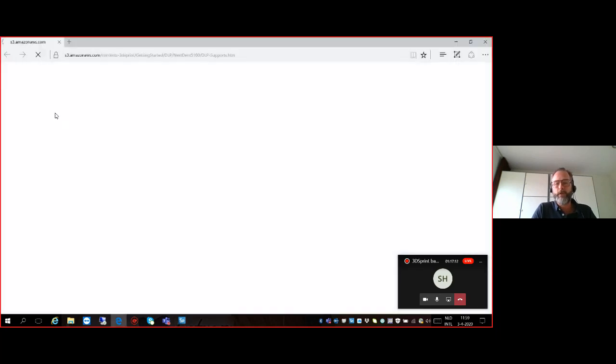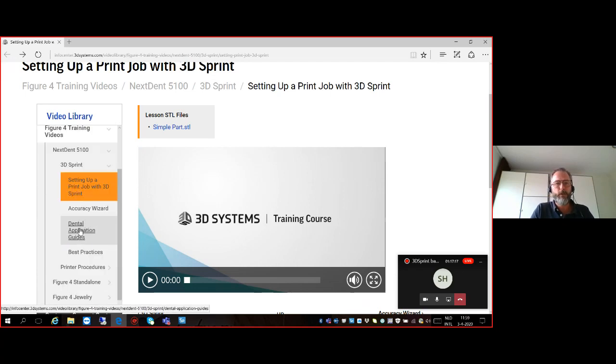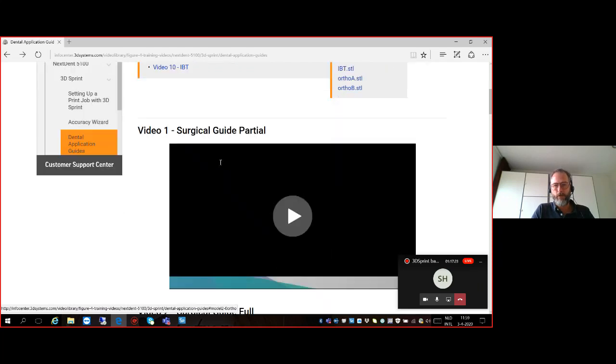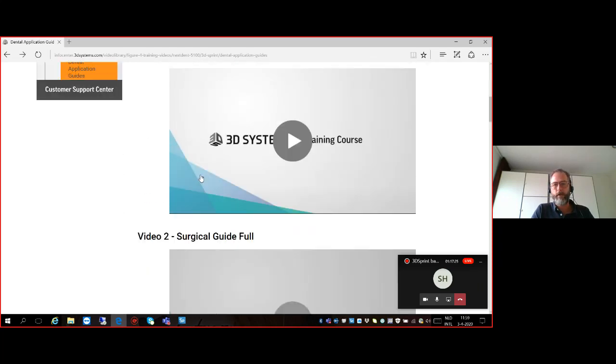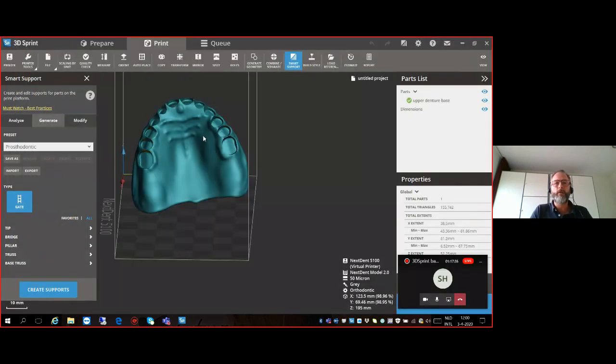And this is very nice, especially if you're new with an application. You can find all the different dental application guides here, and we have instruction videos on each and every application. So everything I showed you is more or less here in this video as well for a specific application. So if you are new to the software, you're starting to print dentures or surgical guides or models, it doesn't really matter. You go to the best practices and there you can find a lot of useful information to help you begin to use 3D Sprint.